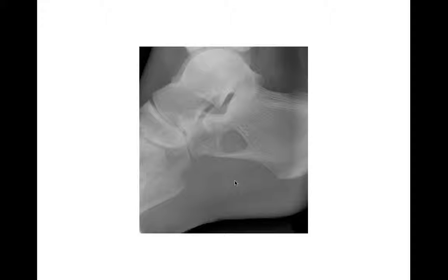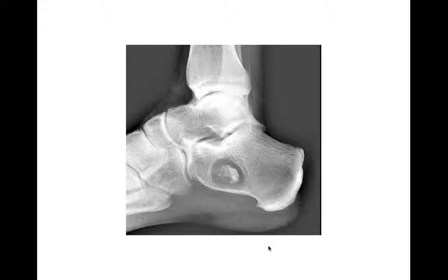It could still be an intraosseous lipoma. Intraosseous lipomas tend to have this central calcification in the middle of the cyst. This is a quite large one in this case. They're not always quite this big. Sometimes they're a little smaller. But if you see that, then it's just an intraosseous lipoma, and you're done. If you don't see it, it could still be an intraosseous lipoma, and you're stuck giving a differential, but it doesn't really matter because both things on your differential are benign conditions.